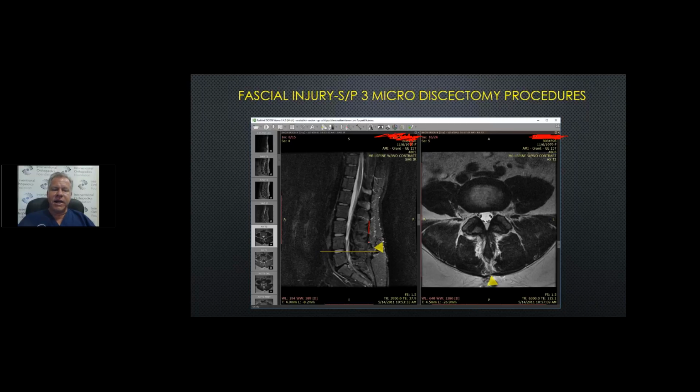But you can see here very clearly that you have a patient who, as I just showed you, has a bump out of the thoracodorsal fascia. And what we should be seeing here is the thoracodorsal fascia should attach like this to the spinous process here and the interspinous ligament. But in fact, you can see the thoracodorsal fascia has pulled off of the spinous process. And you just have to wonder in this patient what in the world is happening here, where you've got a scenario where a major anchor point for the thoracodorsal fascia is lost.